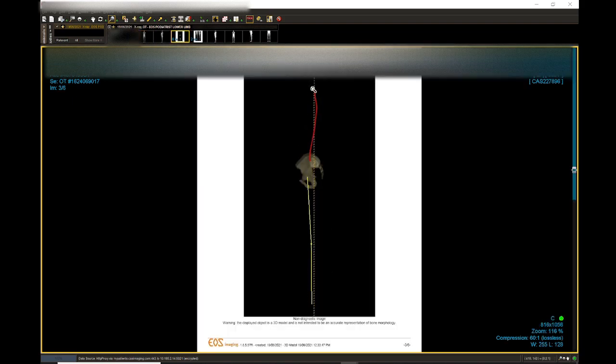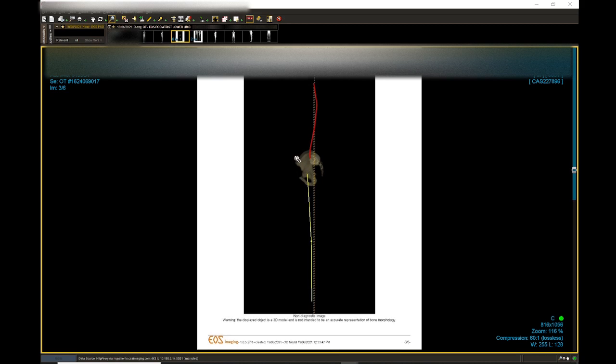From the side, there is a lack of kyphosis and a lack of lordosis too. So you're not seeing a nice curvature. All right. Now, as a podiatrist, we don't necessarily just look at these images and treat the patient, because this is an upper body thing, only if it's related to the leg length. However, most of the patients that have these issues are already seeing a physio, an osteo, or a chiro.